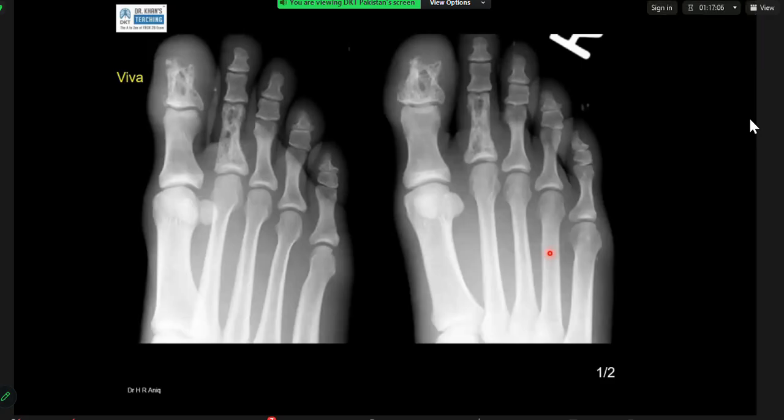Second, I'll keep as TB dactylitis. So sarcoidosis. Anything else? TB ruled out. So there's soft tissue swelling of the first toe, and there's a bony erosion. So less likely gout, but this is not the position, so no other differential. Okay, very good. Well done.